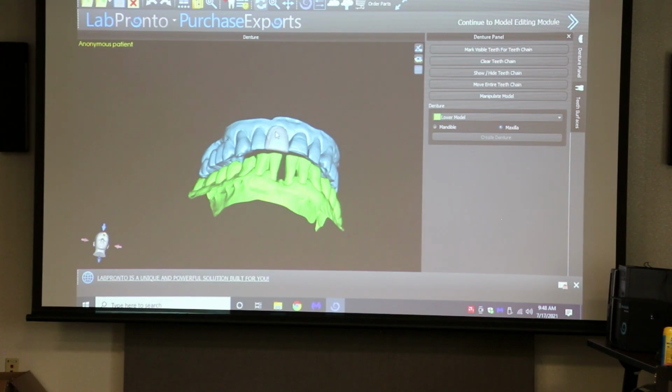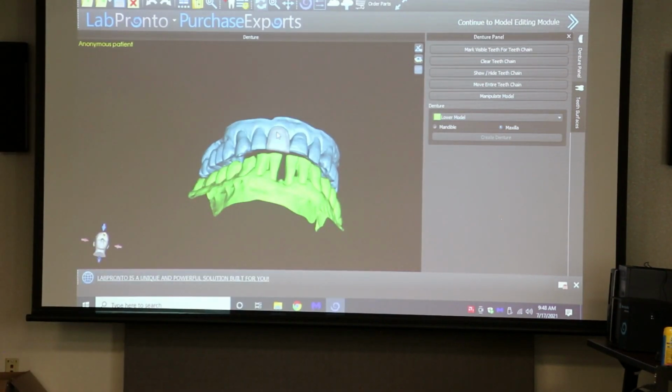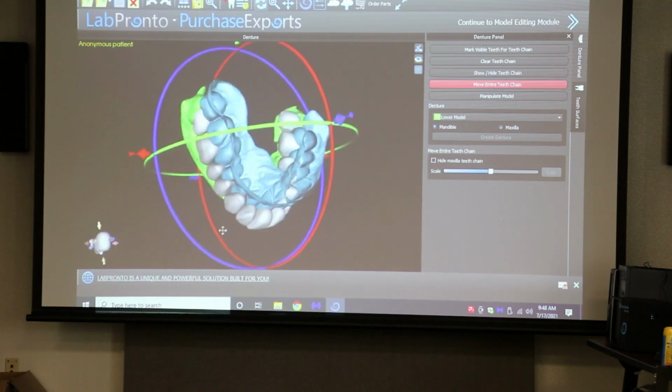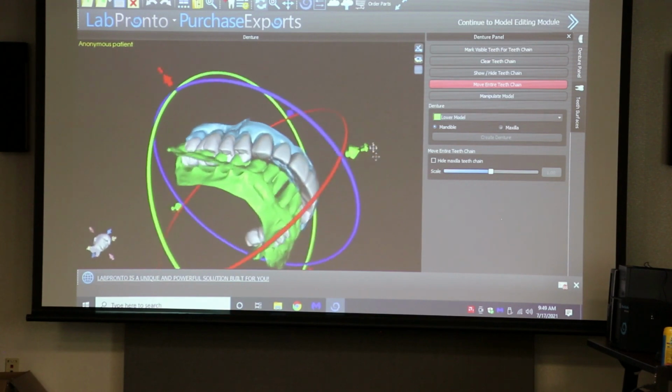Now you do this by shift clicking. So you're going to put your incisor kind of close to number 8, and you're going to shift and then click. One click takes about 3 seconds, and it's going to put in this whole chain of teeth. Now you can see, look, I was off. I clicked it, and it's close, but it's not quite there.